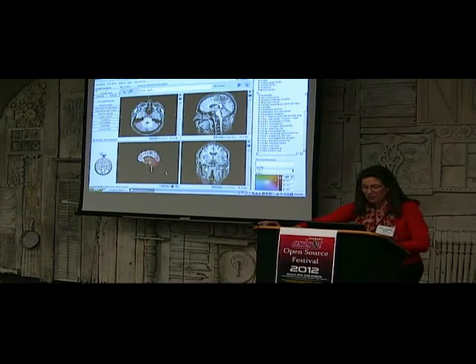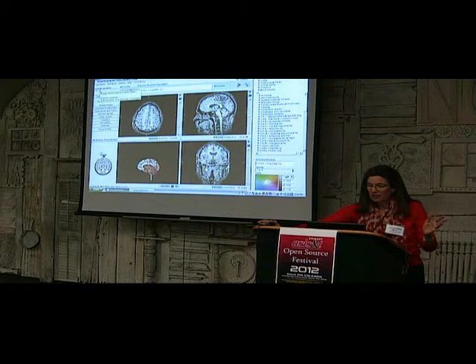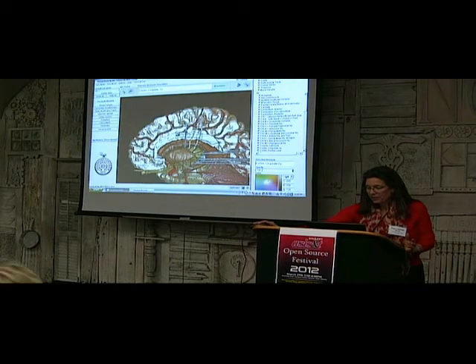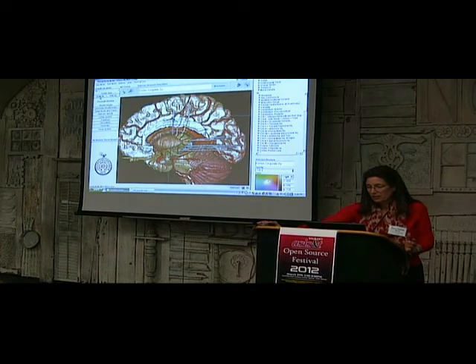So let's jump right to the 3D window. You can view any of these windows. Remember I said you could scroll up and down through these models. And you can change them so they look like an MRI, or so you can see the color. But this is the window that most people spend their time in first year. And so we can zoom. And right now I'm looking at everything that has been colorized. So I've essentially got show all viewed here.